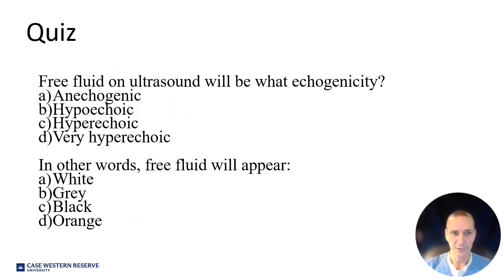Okay, quiz. Free fluid on ultrasound will be what echogenicity? And that's anechoic. In other words, free fluid will appear black.